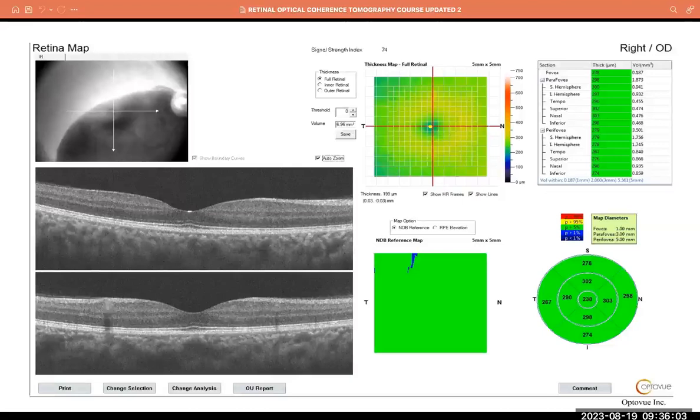Now after the retinal map, you see the fundus image or SLO, as some persons will want to call it. You look for where the lines intersect. Then if you go to the thickness map, you would see something strategic there. The lines did not really cross at the fovea exactly. Look at it. You see the yellow dots there. The lines are meant to cross exactly there. So it means that this line shifted a bit, but it's as close as possible, but it didn't cross exactly.